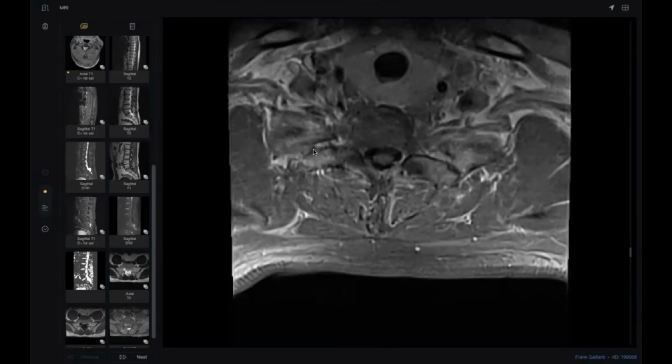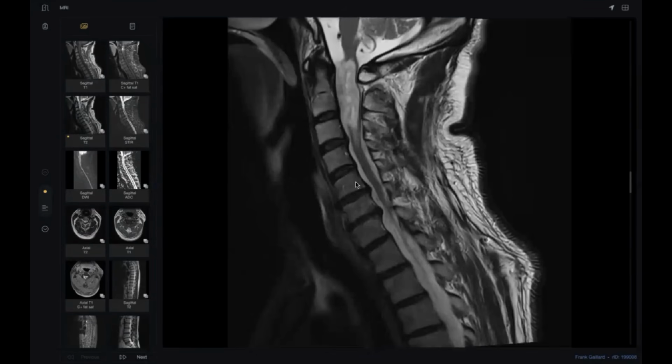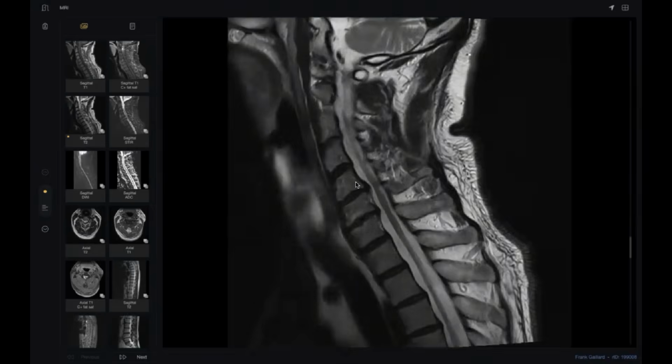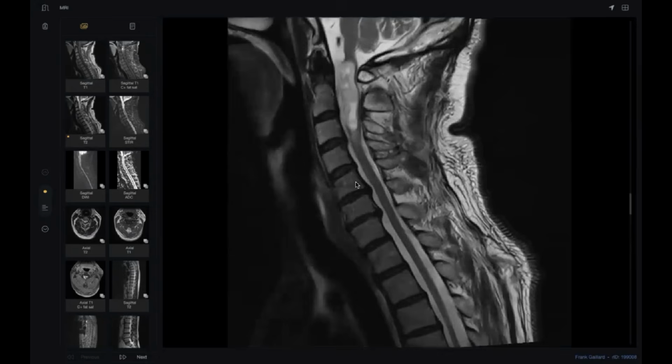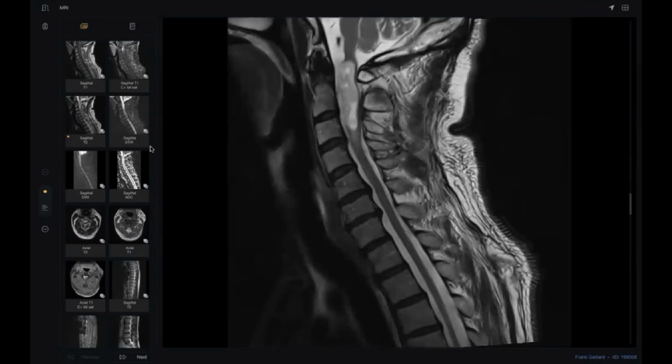Okay, which one is more common? Could this be metastasis? Look again. It is intra-axial. It is less likely to be metastasis. So in this age group, being heterogeneous with multiple cystic areas, this is most in favor of ependymoma. It contains calcification, hemorrhage, cystic changes, and can expand along the foramina. What is your next step?